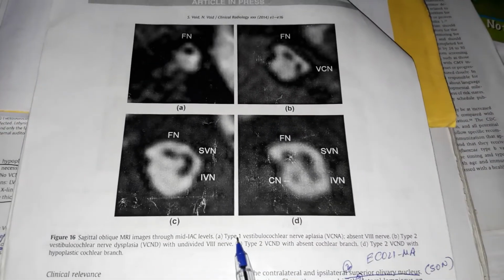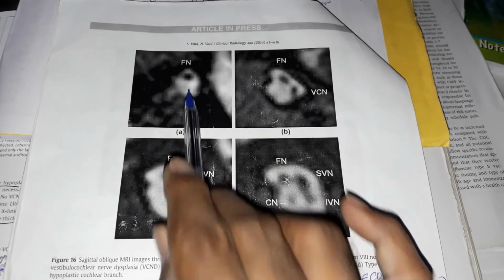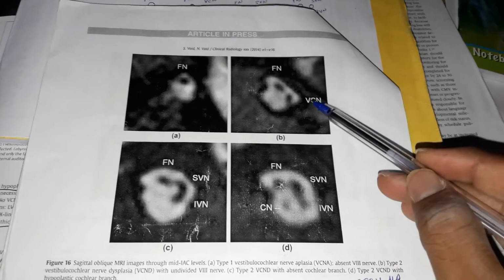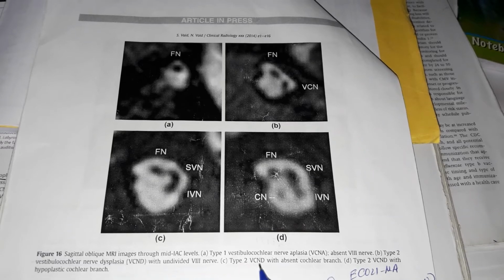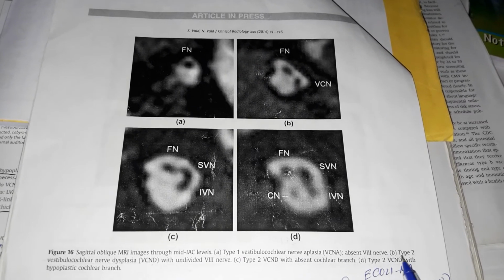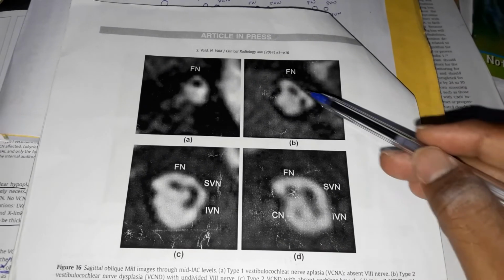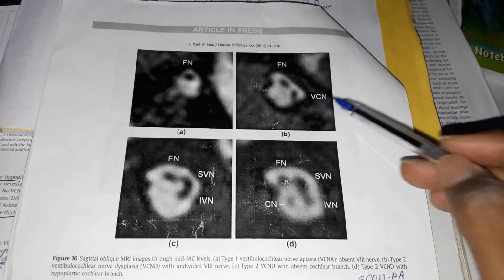See, type 1 vestibulocochlear nerve, aplasia. No vestibulocochlear nerve. Type 2 vestibulocochlear nerve, dysplasia with undivided eighth nerve. Undivided vestibulocochlear nerve. Again, type 2 is dysplasia, and type 1 is aplasia. So type 2 is dysplasia with undivided eighth nerve, the undivided vestibulocochlear nerve.